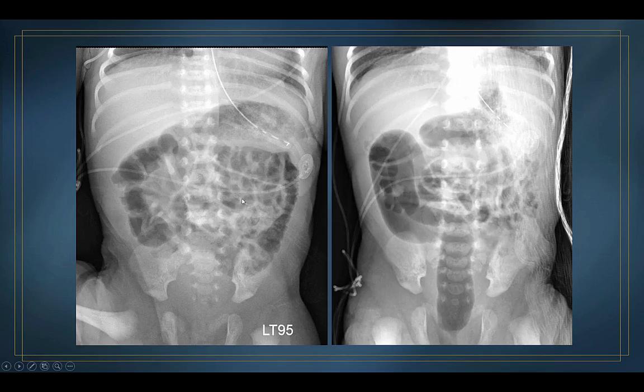Now this is the supine and decube on the same patient, and it's like, is this all colon where I sort of see a continuous loop here and a continuous loop here and a continuous loop here? I'm even amazed by this case because look what happened on the decube. All of that air that was in the transverse and descending colon seems to have moved over to the sigmoid and rectum. So it absolutely clears the path for calling this a relatively normal gas pattern, which I may not have been willing to say on the basis of the supine film alone.